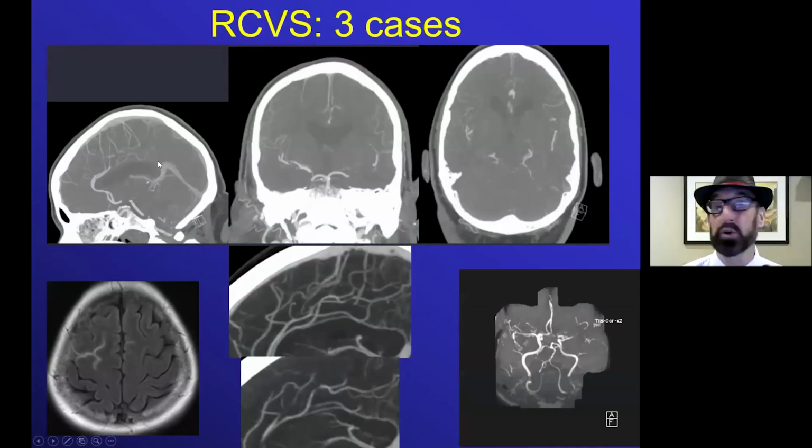However, they also will show vasoconstriction, large vessel narrowing, in the patients. Unfortunately, that vasoconstriction may not be present on the first day of presentation with the thunderclap headache. It actually may develop over the course of 3 or 4 days. So it's almost like subarachnoid hemorrhage, where we don't see that vasoconstriction initially on the original subarachnoid hemorrhage from, say, an aneurysm, but over the course of days, it gets worse.